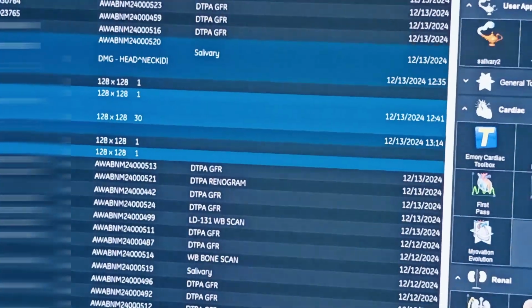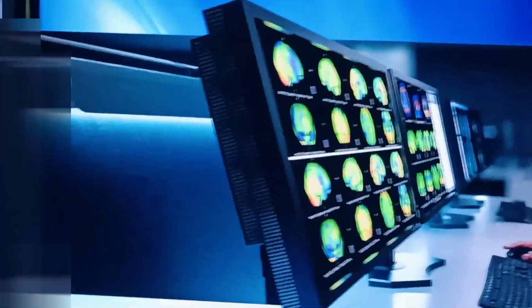What application did I select, salivary, right? Okay, one minute, let's start.